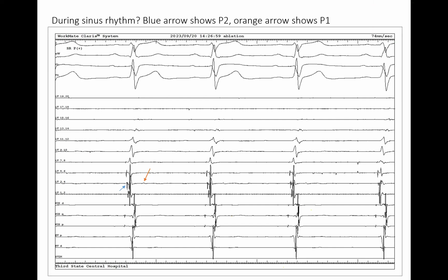Diastole or systole? QRS complex, squeeze, then what happens? Squeeze and relax. Yes, the valve is wide open. So it might be valvular, chordae, or subvalvular structures. It's not an electrical signal that you're looking at.